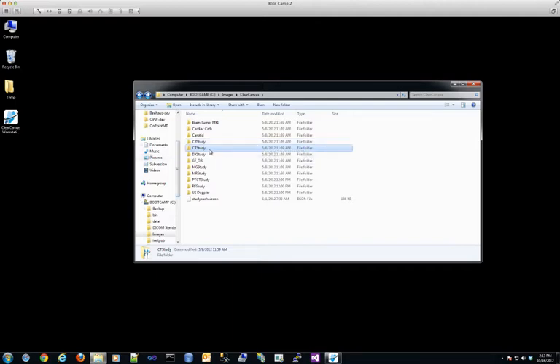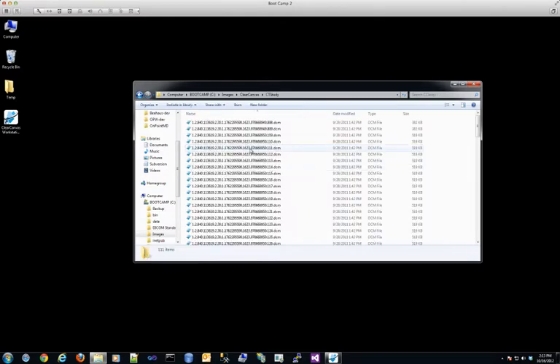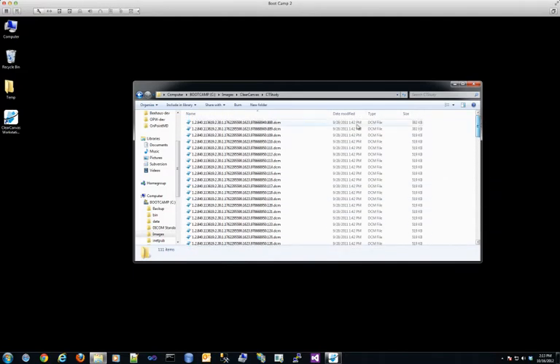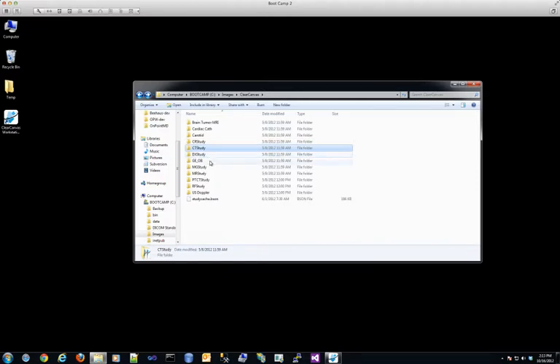What we mean by DICOM data exploration is dealing with the problem of a large number of DICOM files on your hard drive and not really knowing what's in there, and it can quite often be useful to look at these DICOM files in a quick way to understand what's there. This is one of the key features of the Study Analyzer tool.